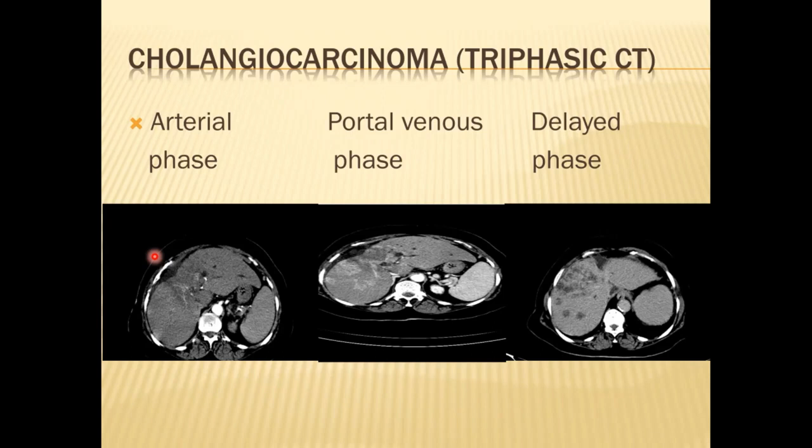Hepatic cysts do not show any enhancement; it is a non-enhancing, benign lesion. Hepatic metastasis shows wall enhancement. Peripheral nodular enhancement.